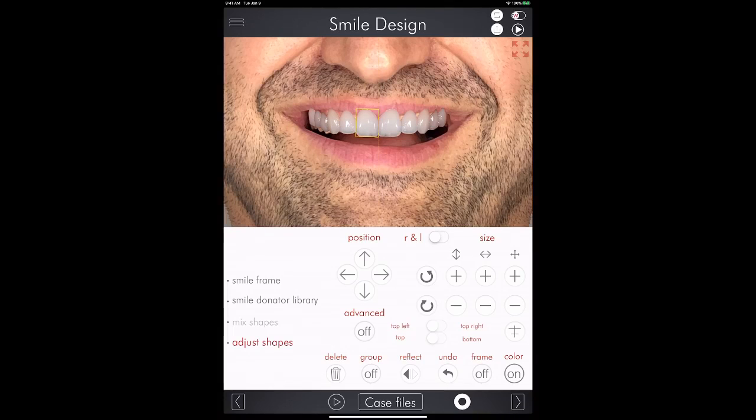Also, the central, for example, is a little bit too square, so I'm gonna distort the distal lower corner of the tooth, and move the corner just one click up, so that I get a better form, and they are not so square in my face.